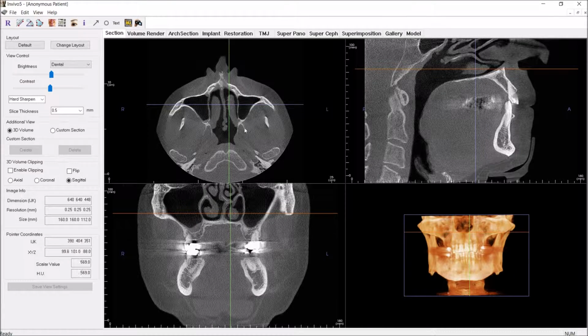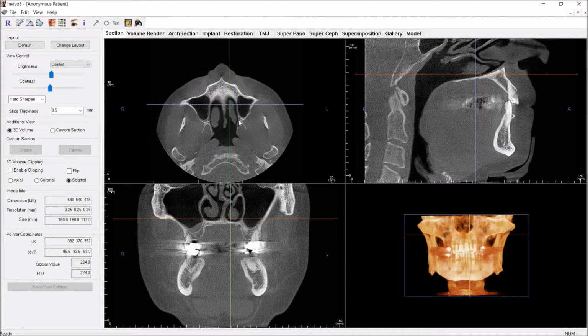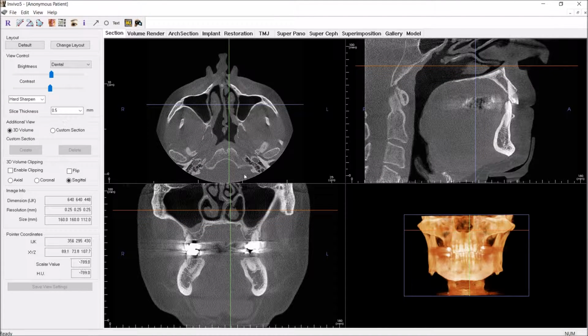And you've got to account for every foramen, every canal that you see. So here we see a canal. You may know what that is. Some of you may anesthetize it. That's the greater palatine canal. Of course, posterior to that, you see the lesser palatine canal. You can kind of follow those up as you scroll through. You can see those in other planes as well.